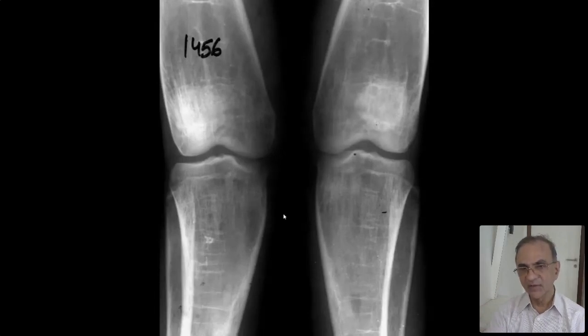So this is an abnormality starting from the diaphysis, going through the metaphysis. The epiphysis is relatively normal. So this is some form of diaphyseal dysplasia producing metaphyseal abnormality, non-tubulation. This is not primary metaphyseal dysplasia. Okay. So the common one that does this is craniodiaphyseal.